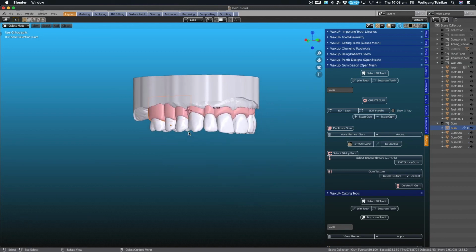Okay, so I'll conclude this short video and then we'll go on to the next one, which involves finalizing this section with a bit of sculpting perhaps, and then we'll start the bar.